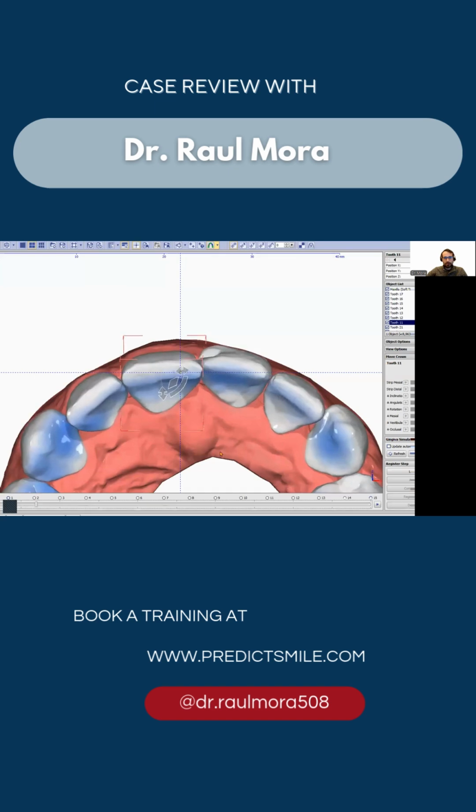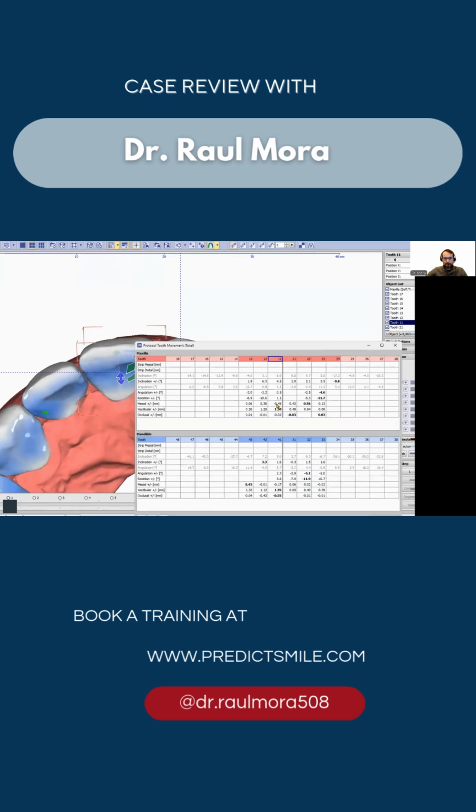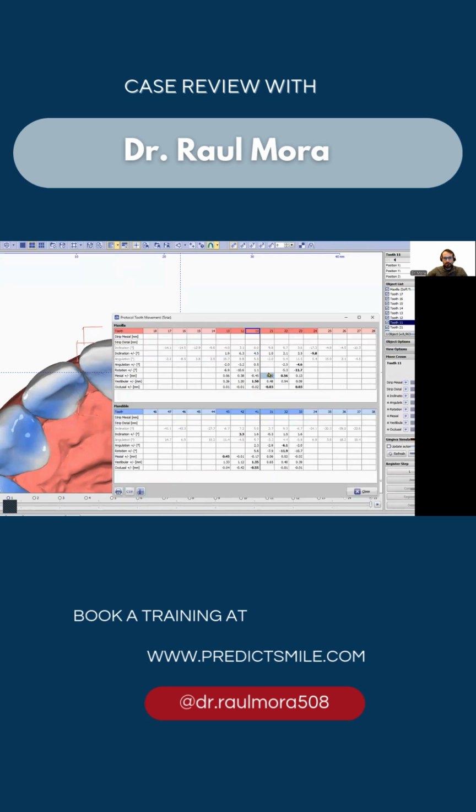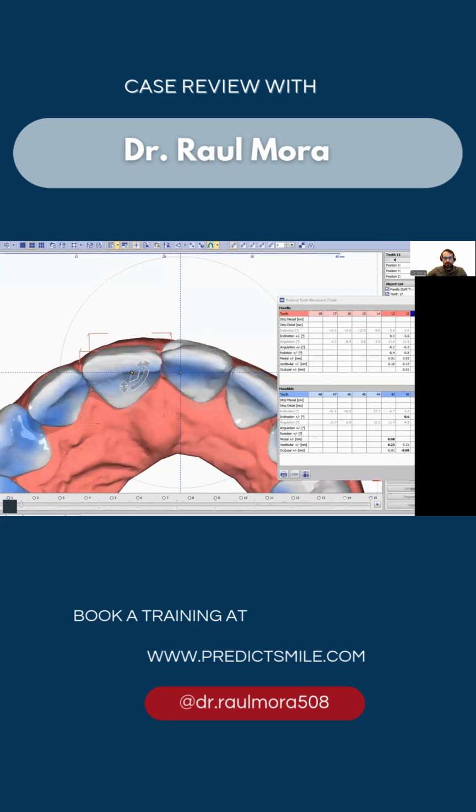So also here we need to do something about it. Let's check the movement of the central incisor. The central incisor doesn't have much rotation, but only proclination, so we can leave it as it is with no special staging. And this one, probably we may have to slow down or delay the movement so we don't have this collision, and wait for the central incisor to move forward, allowing the space creation for this other tooth to move. So we may delay the other central incisor's movement till we have some space here.